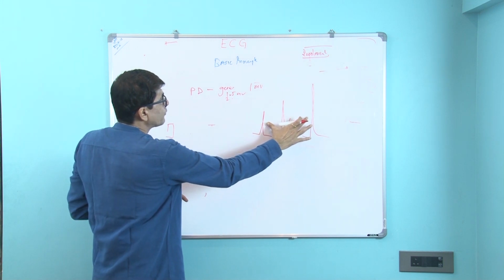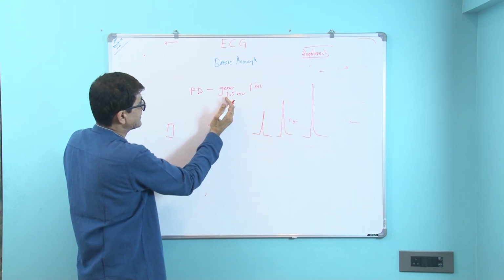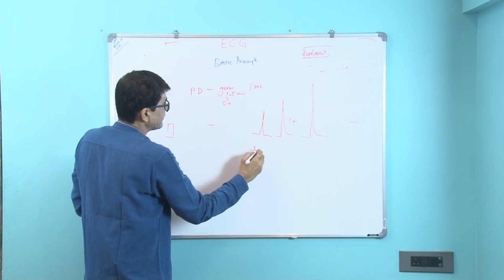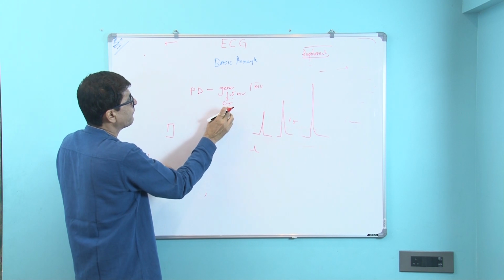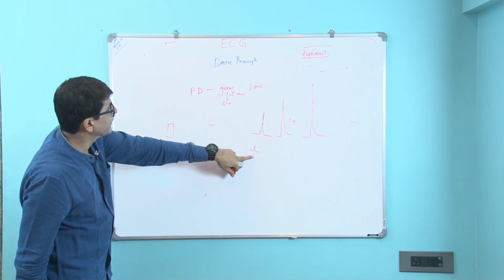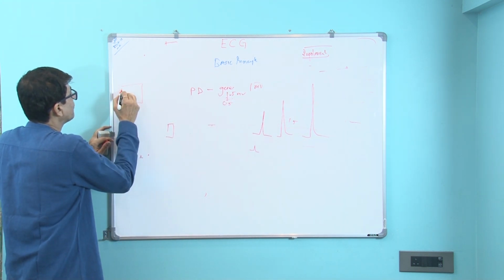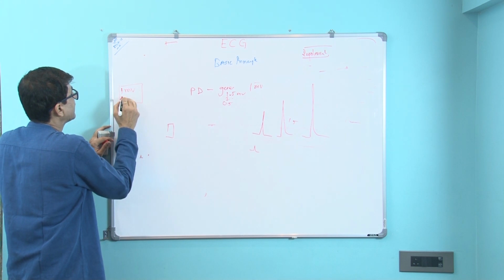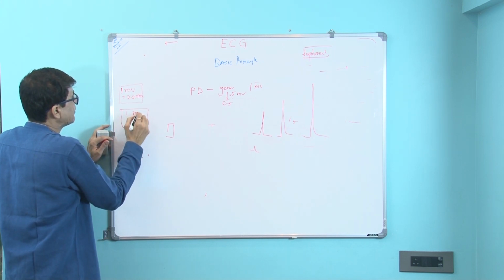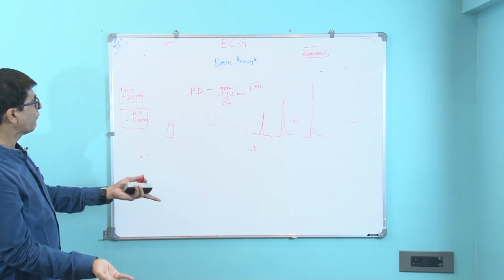Now this you can change. If the potential difference is less, suppose 0.5, it will record a small wave because 0.5 will be equivalent to 5 millimeter. But if you are not able to read, you change the setting. There are knobs here. 1 millivolt equal to 20 millimeter. Here 1 millivolt equal to 5 millimeter. 10 millimeter is the default setting.